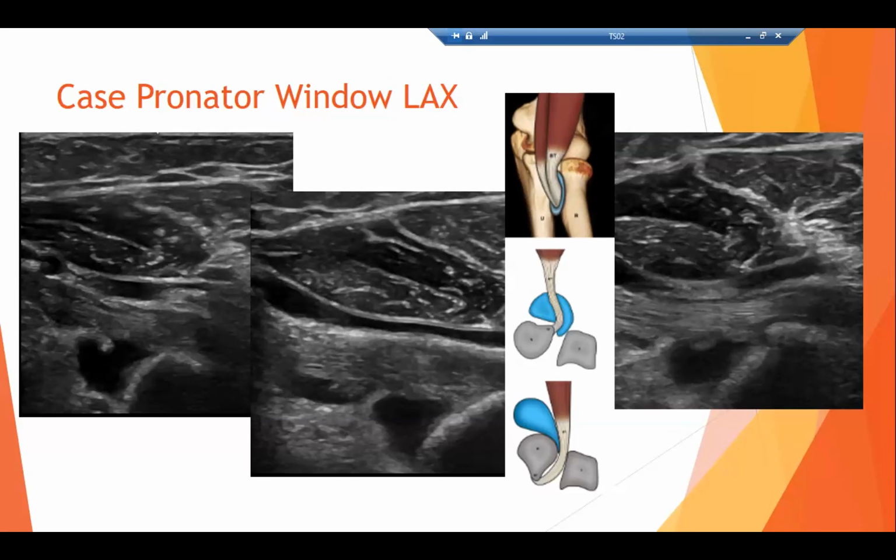In those locations we see these undersided tears, just like we a lot of times see here at the biceps. So as far as how the tears develop, I think they're probably secondary, or at least the osteophytes are contributing to those.